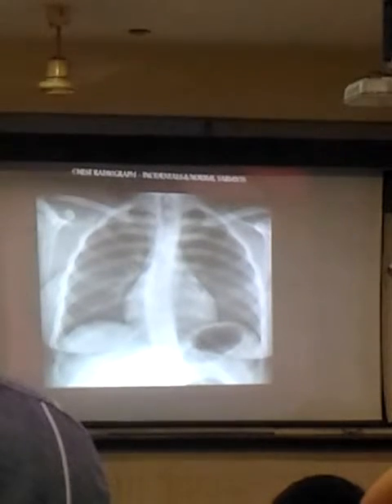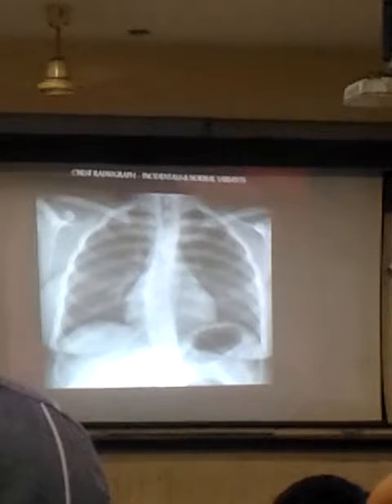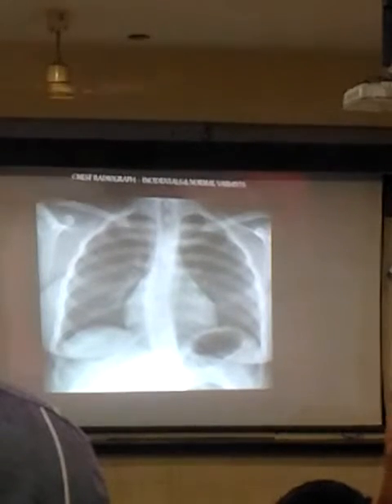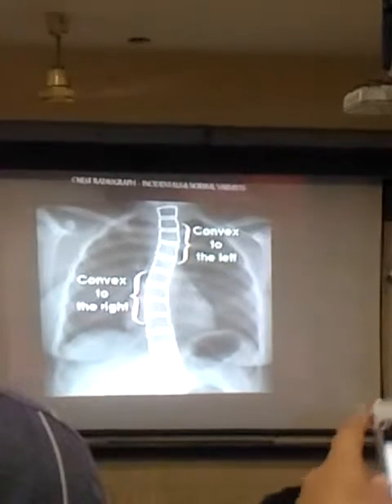So they will give you a chest radiograph like this. Right? You will keep searching in the bones, lungs. There is nothing abnormal in the lungs. But with presence of mind, if you look at this spine, you will be able to pick up the scoliosis there. Yes.